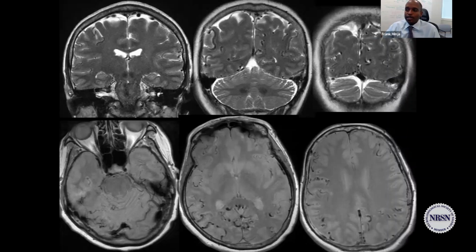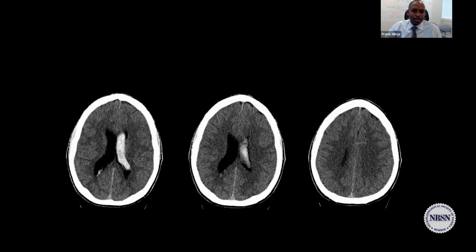When you have corticovenous drainage, it is usually not one vein. There are many veins that are going to basically engorge because the whole venous system is dilated. So we're getting towards the end. I think this may be the last case. Intraventricular hemorrhage over there, right? It's like next case, right?